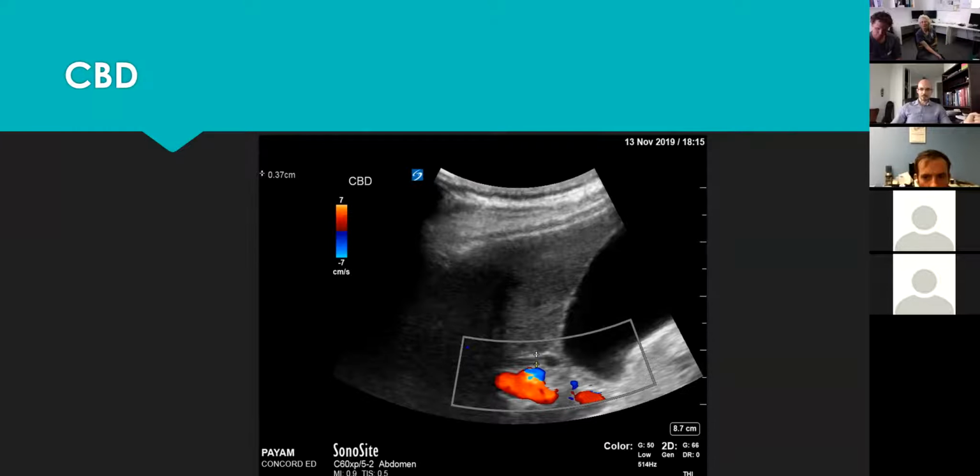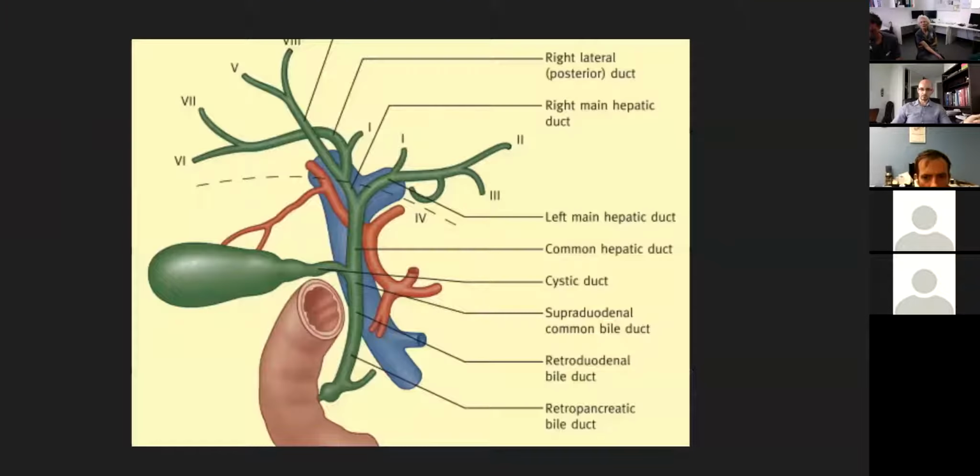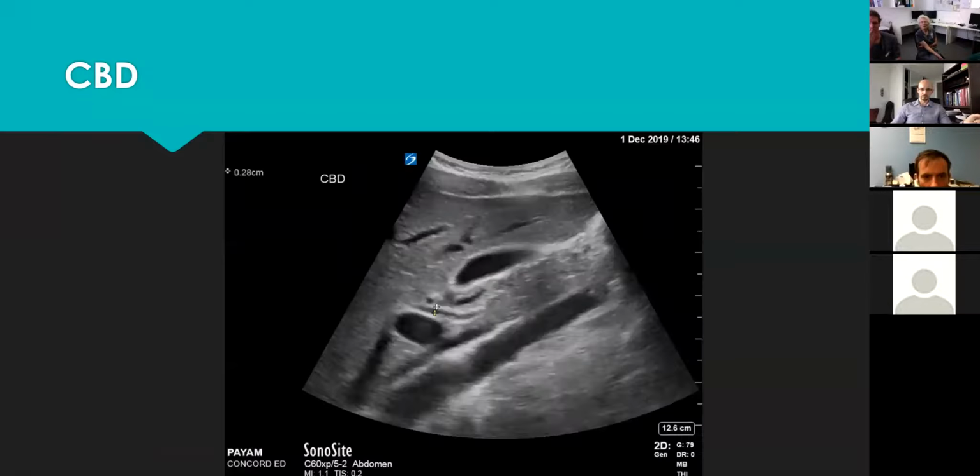Sorry, Payam, can I interrupt you there? Sure. Can you please go to your previous slide, the CBD one? This one? No, one more. This one? Yeah. So if you don't mind, can you please explain what other structures you can see in these?